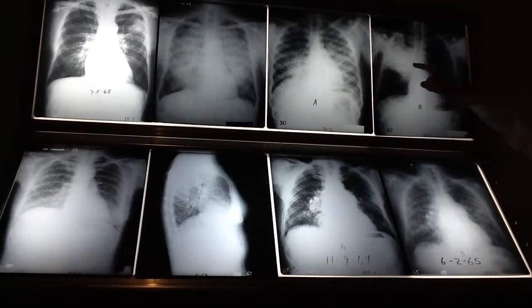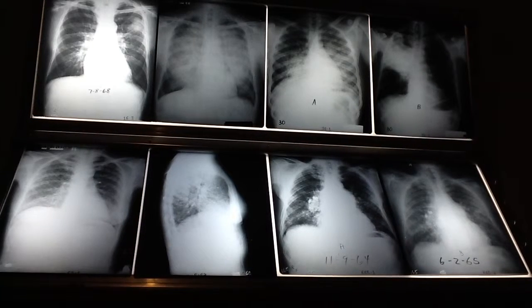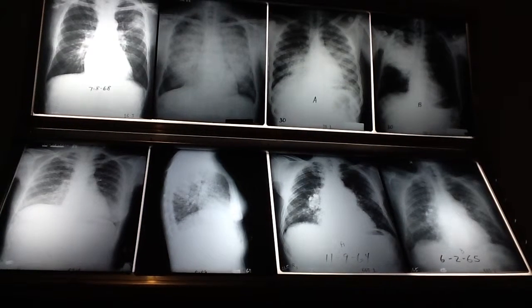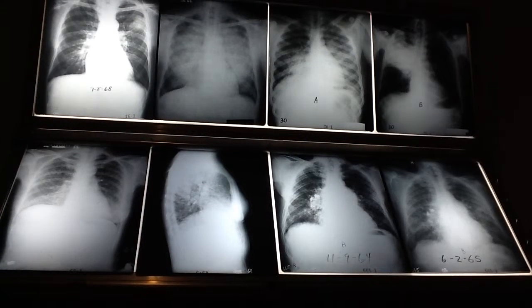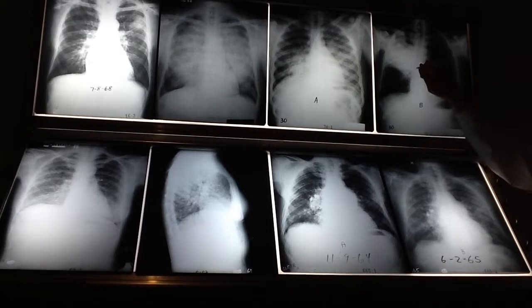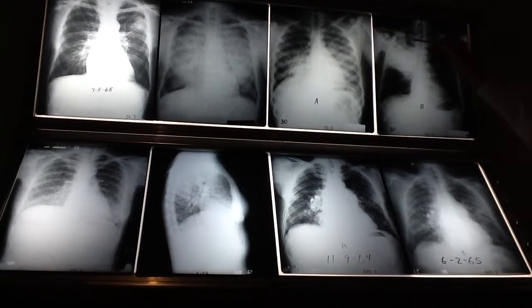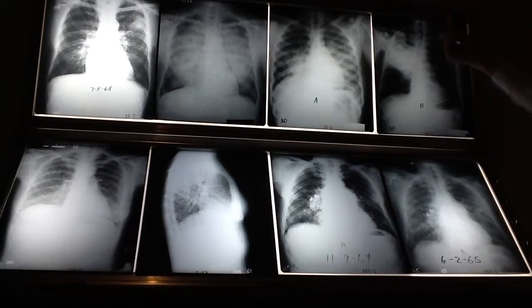So if you can see the fissure over it, the density has to be where? 7 or 10. It's got to be behind the fissure. So it's this. Not this. It's got to be behind it. 7 or 10. And that, without the lateral, we don't know. But that's an area of consolidation. So is this. But this is segmental in number 2. I think there's probably a little bit up into number 1, but not all the way to the apex. And 3, no way to know about 3 without looking at the lateral.